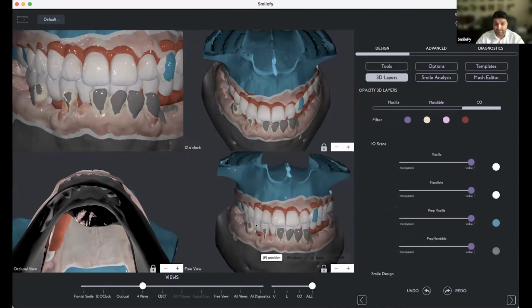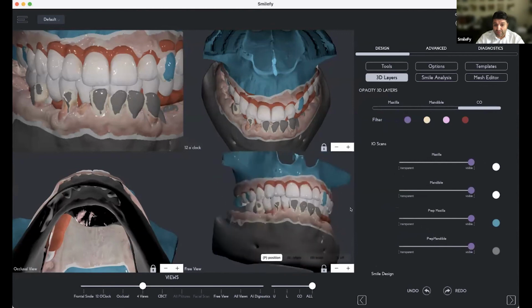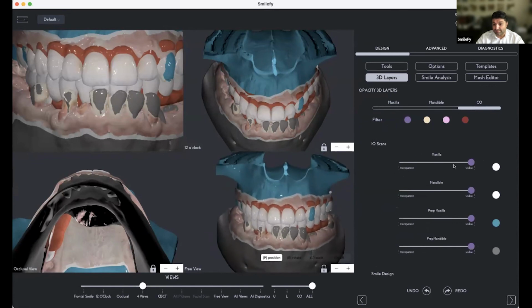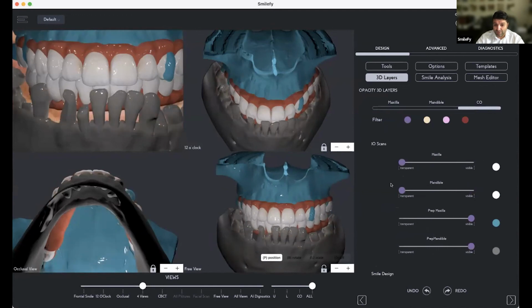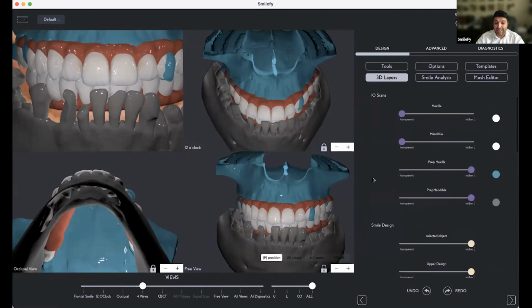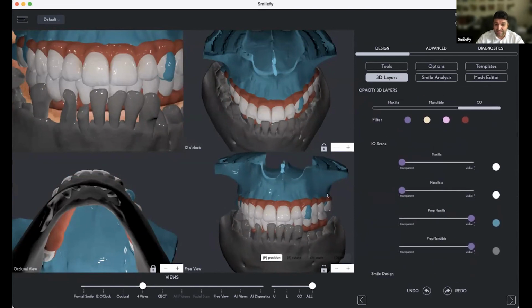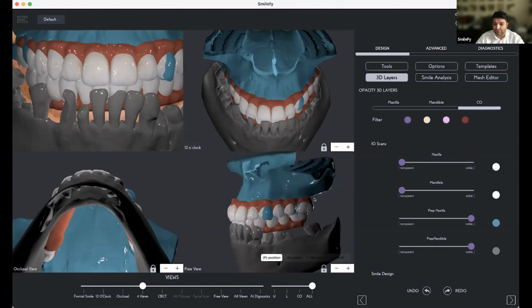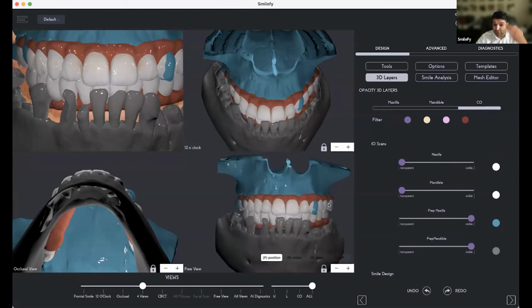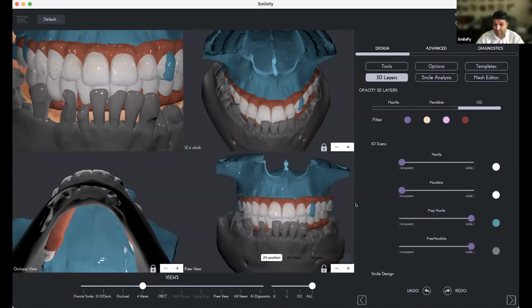Okay. Yeah. So as I promised you, here is, for example, everything superimposed, right? Superimposed with the DICOM file, with the full arch implant bridge. But you see, there is something that I just realized, and I'm gonna find a solution. I'm gonna change it because that's interesting. The CBCT file is in a different position, of course, than the centric occlusion, but we do have the option to calibrate or export the CBCT file in two pieces, maxilla and mandibula, right?